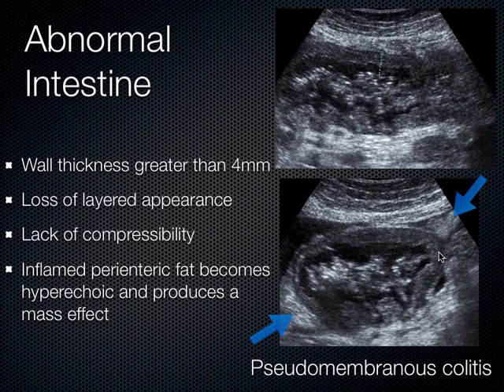Not unlike the way patients with cellulitis, with skin infections, you see all these hyperechoic islands there that you're going to learn about pretty soon that we call cobblestoning. And so anywhere in the body with ultrasound, whenever there's inflammation, it appears as hyperechoic areas. That's how inflamed tissue looks.